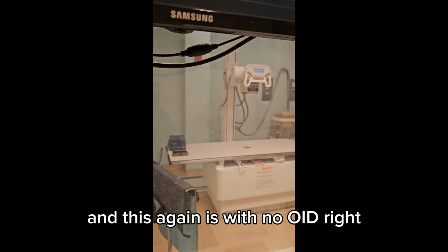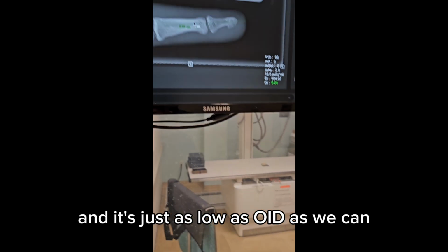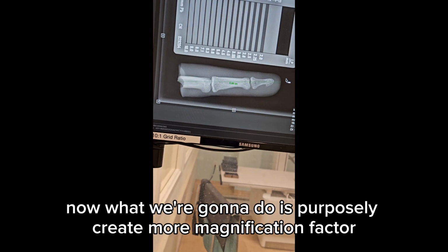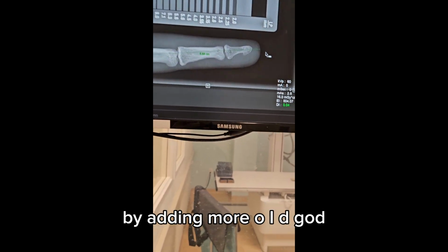And this again is with no OID, right? And it's just as low as OID as we can. We still have a magnification factor of 1.17. Now what we're going to do is purposely create more magnification factor by adding more OID.